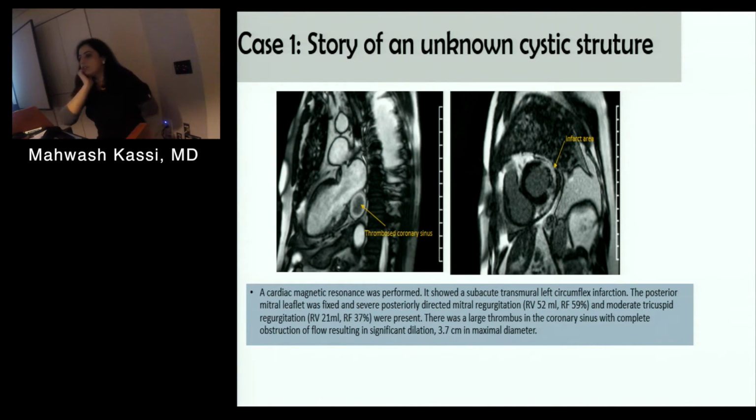Okay. Basically, the MRI findings were consistent with a coronary sinus that was completely obstructed. There was no flow. Do you have a contrast view of that two-chamber? Because what you have there is just a single phase, non-contrast image. I don't have that. To prove it to yourself, you want to see that there's no contrast uptake in that area to say there's thrombus. So you want one phase and then a delayed phase to make sure there is no contrast uptake. Okay, that makes sense.